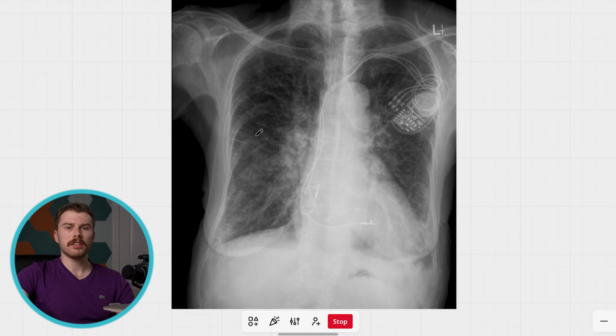Well, it's kind of hard to the untrained eye if you don't know what normal looks like, so I'm going to show you normal in a second. Wait a minute. Oh, I'm talking about the wrong thing. This one's even harder than what I originally thought it was.